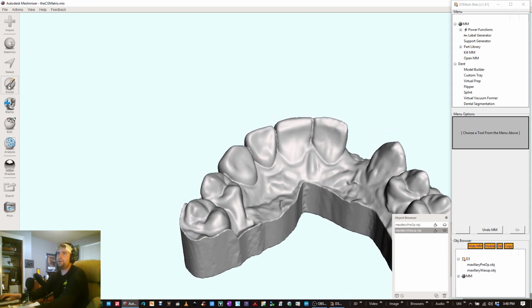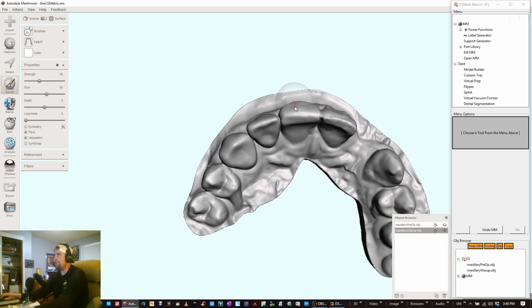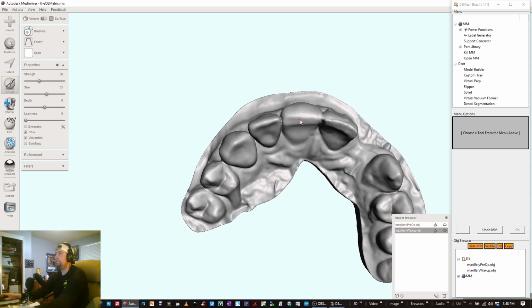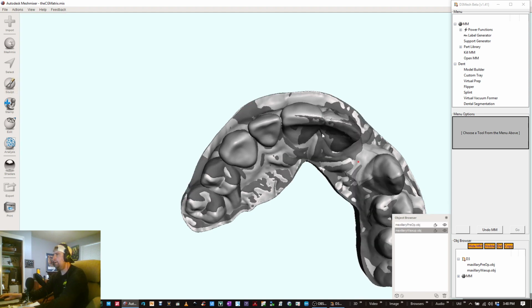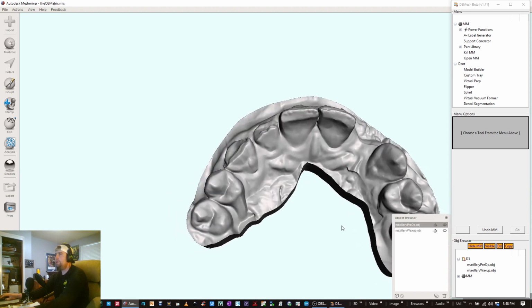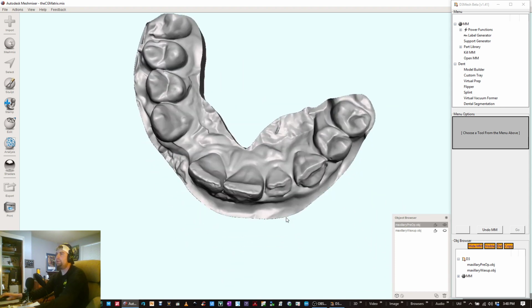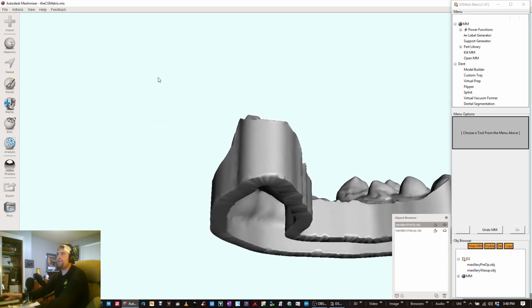It is under Sculpt, and look, I already got it selected. Under brushes, there's attract, and once you put that library tooth, you superimpose it on top of that little shell that was there. So yeah, he had an entire lingual surface here that is perfectly fine. It was just the facial that was kind of messed up.